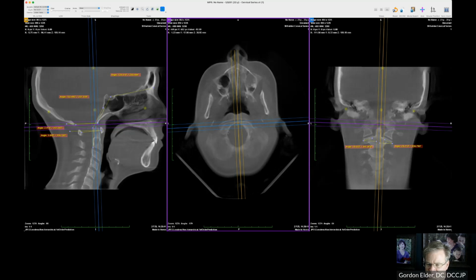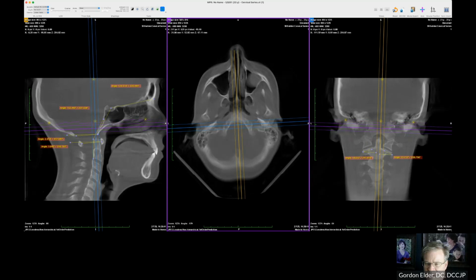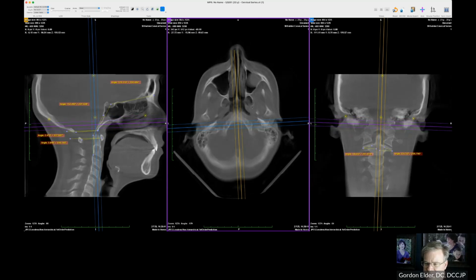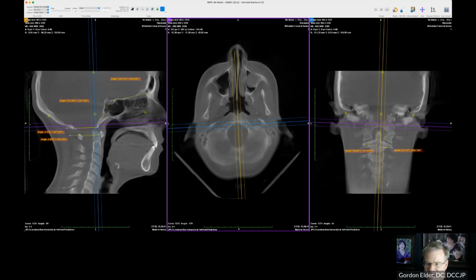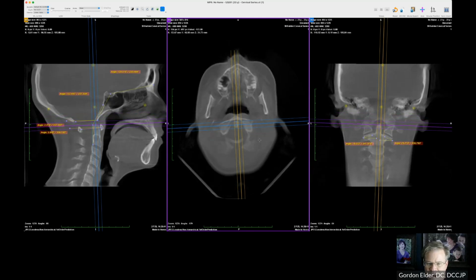That was this line here, but you can see she's fairly symmetrical compared to where her EAMs are at the posterior part of her skull. But look here, well, we got a little sinusitis there, but the anterior part, look at that vomer, the hard palate, they're all angled off to the right in her.